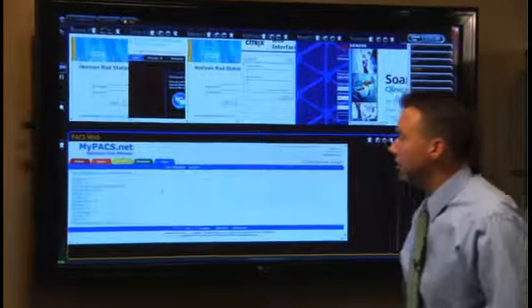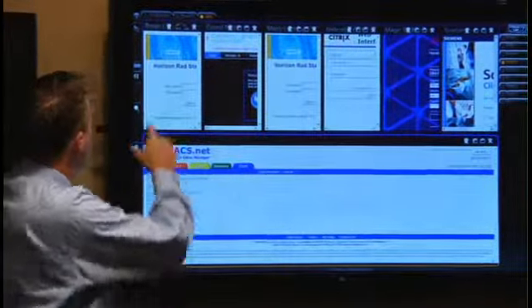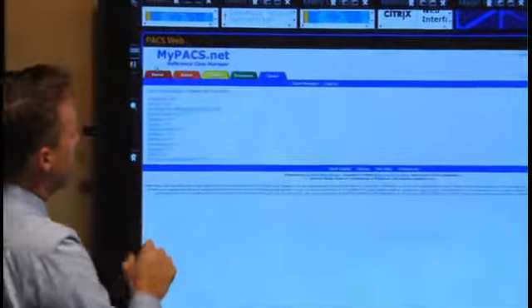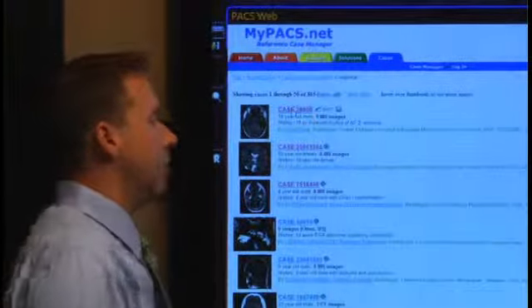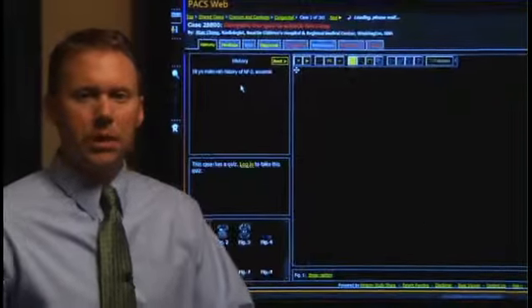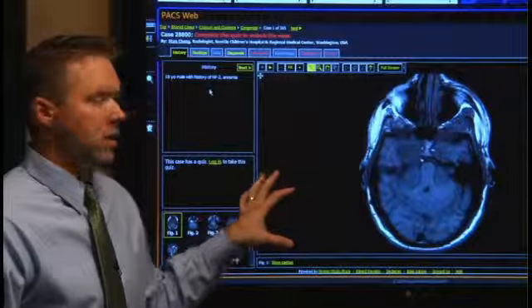So if I were to pull up, this is a typical PACS viewer that's free out there online. I'm going to shrink these down just a little bit so we can see this a little bit better. I can actually use this as if I'm sitting at my desktop. So if you are a circulating nurse, if you are a physician, PA, whatever, as you're sitting at your desk using your IT applications, it's exactly the same thing as you'll see within ControlOR. And this is a huge benefit.